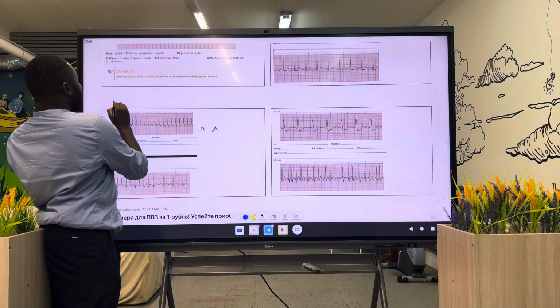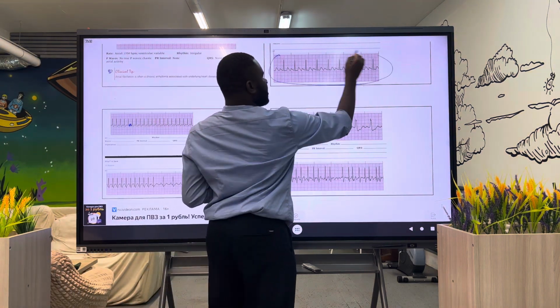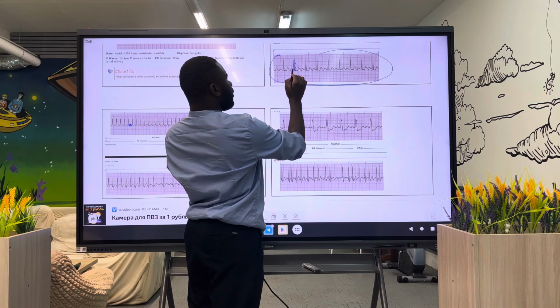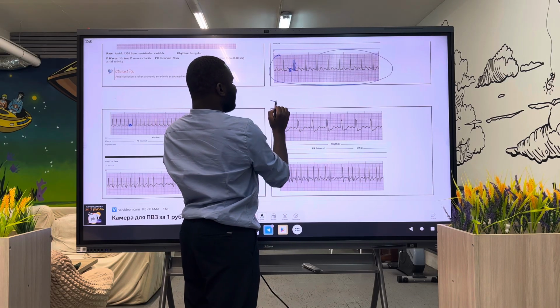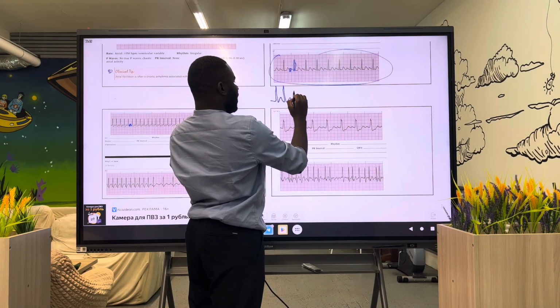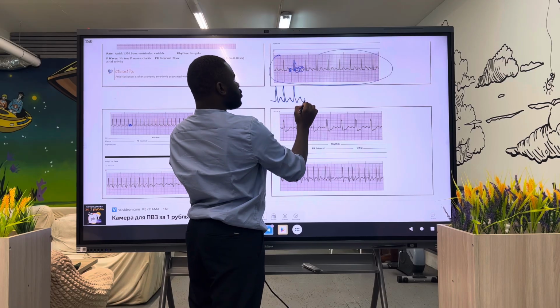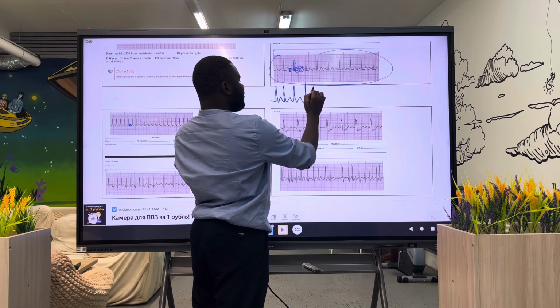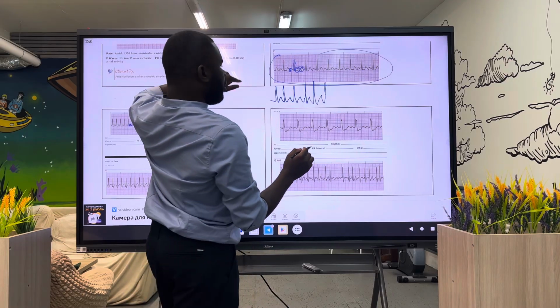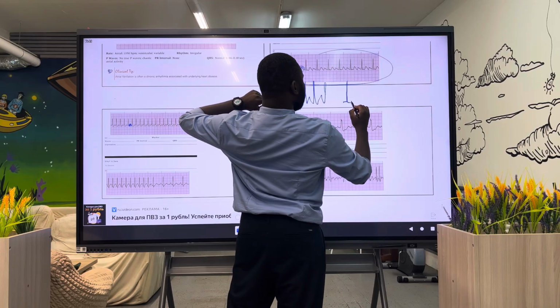Let's say we now push this ventricular contraction here. So we will now be having something that looks like this. One ventricular contraction, another; instead of two teeth, we put one tooth in between. Now if we look at the picture we had previously, the SVT also looks like this.